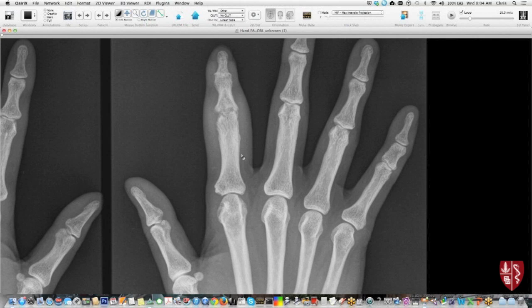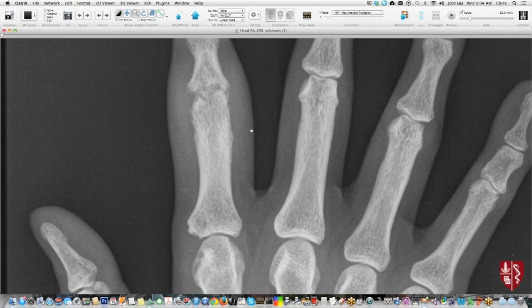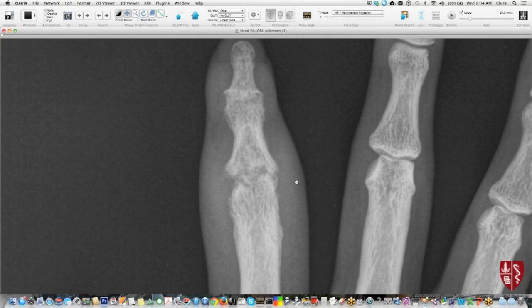And that sausage term should ring a bell as one of the kind of Aunt Minnie diagnoses in radiology. What arthropathy are we thinking about if you say sausage digit? Yeah, psoriatic arthritis. And so that's an inflammatory arthritis. And so in this patient, what I'm thinking is, well, that looks pretty abnormal, and it looks like it's inflammatory. The reason being that the margins of the bone are really irregular there, and that's compatible with erosive change.